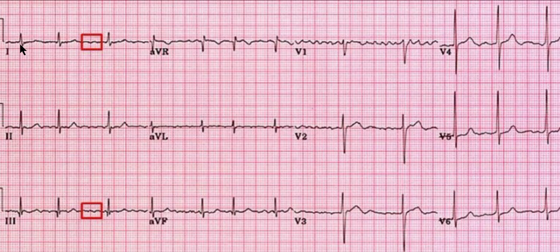Then you look at the QRS and T waves. This is the second step, and in this you can't appreciate the P waves. Because the atrial rate is around 400 to 600 beats per minute, the atrium produces very little electrical impulse in one impulse, and it will give a fibrillatory type of pattern on the isoelectric line, and this is fibrillation.